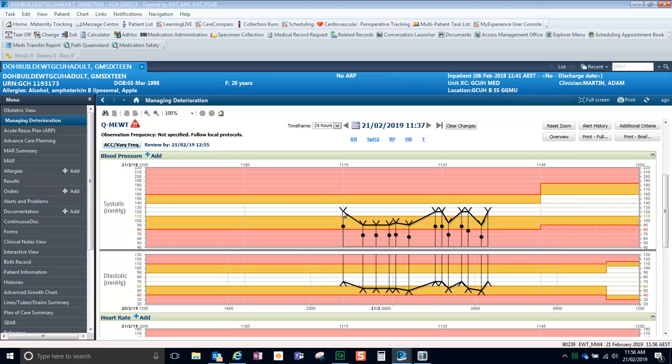The diastolic blood pressure graph is located directly below the systolic graph. Again, to see the details of any charted value, hover over it with the mouse. You can also see any alterations to calling criteria by noting fluctuations in the coloured bands that represent the zones that have been set for each vital sign. Dotted lines clearly delineate the normal calling criteria values, which are also shown as coloured values on the graph value labels.